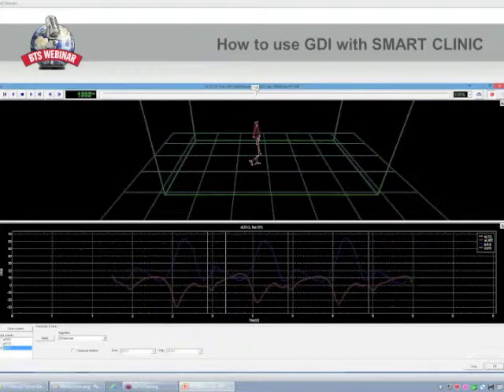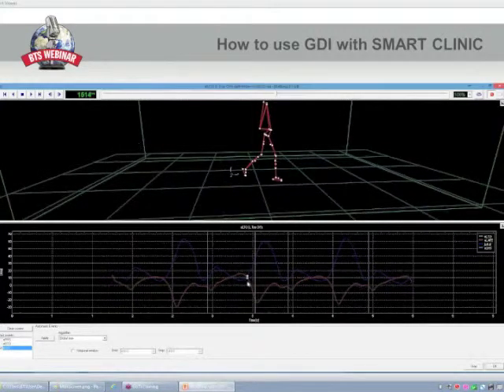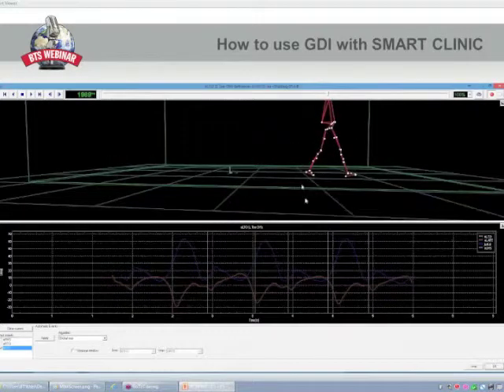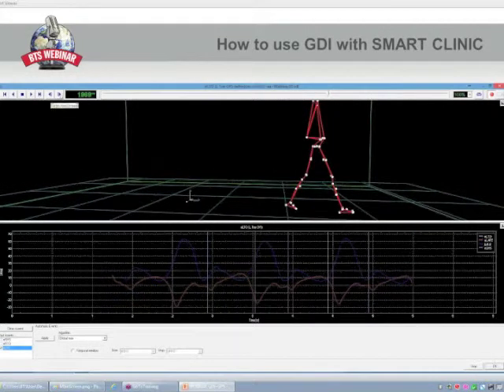In doing that, you can also help yourself by looking at the two graphs represented below, which represent the knee flexion extension angle, that is the one represented in blue, and the ankle dorsiplantar flexion angle, that is the one represented in red. If you want to modify that, you can do it by modifying the protocol and choosing the desired variable.